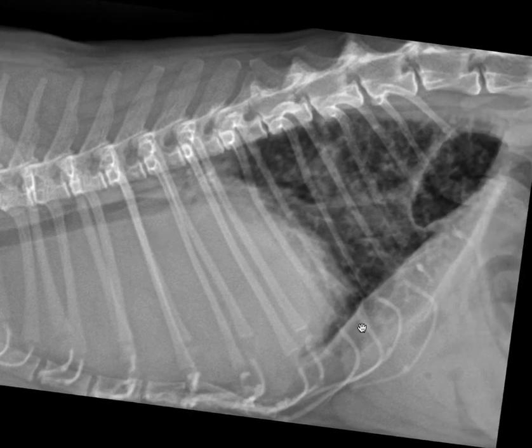But a great example of a bronchial lung pattern, we didn't talk about differentials for that yet. My general differential for a bronchial lung pattern in a cat is to prioritize feline asthma, which is often the most likely thing. However, other causes can actually include neoplasia, in particular lymphoma or carcinoma, which is thought to manifest because of peribronchial lymphatics, which can spread neoplasia. Lastly, in cats, heart failure has actually been described to potentially present as a bronchial pattern. So in this kiddo, I would have to have all those things on my list for sure.